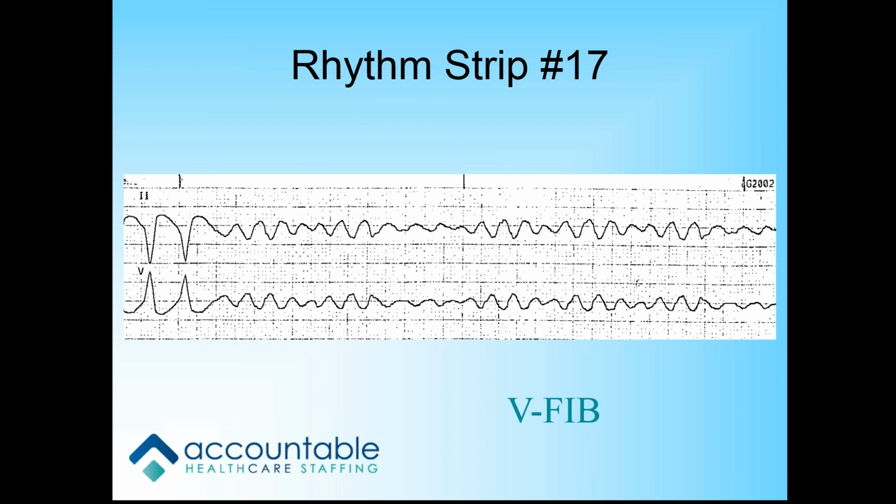So for my L&D nurses, my oncology nurse, and my med-surg nurse, this is one of those lethal rhythms that you have to identify. Are there any questions on it?